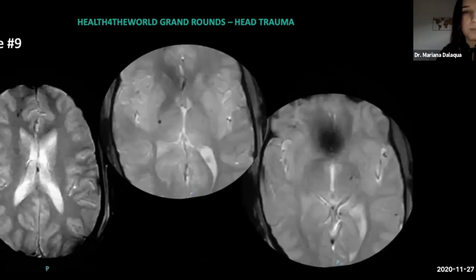And here, remember, the patient had this symptom of retrograde amnesia. So it was interesting that she had a lesion on the fornix that would explain that. And we also see some other peripheral foci of diffuse axonal lesion. Another one in the right posterior branch of the internal capsule, and a deeper one in the transition of the thalamus to the left cerebral peduncle here.